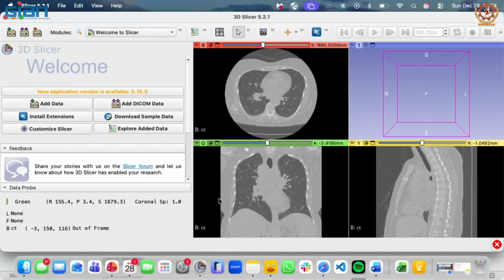So it's very important to know where the tumor is located, because when radiologists get the CT and find there is a tumor, they would ideally like to write a note that the tumor is in the right upper lobe, or it's in the hilar region or something like that. So can we automate this process, segmenting the lobes of the lung? It's very easy.